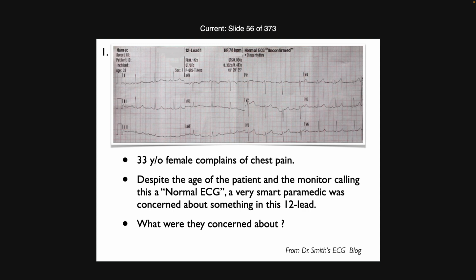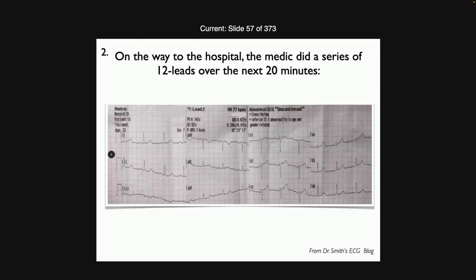So even though everything here points to, oh no, this is not a patient we should be concerned about, this paramedic was, and on the way to the hospital, this again is showing you, yes, you can do ECGs while you're driving. They did. Now, this is over the next 20 minutes. Unfortunately, they X'd out the time, but it had to be not too many minutes apart.